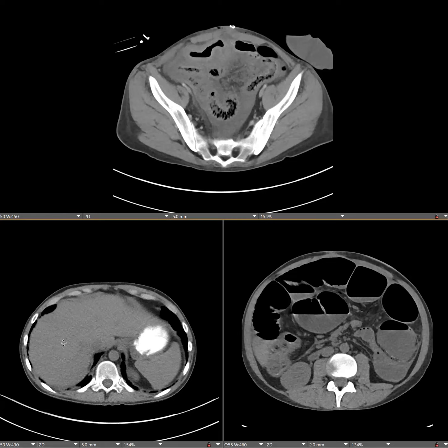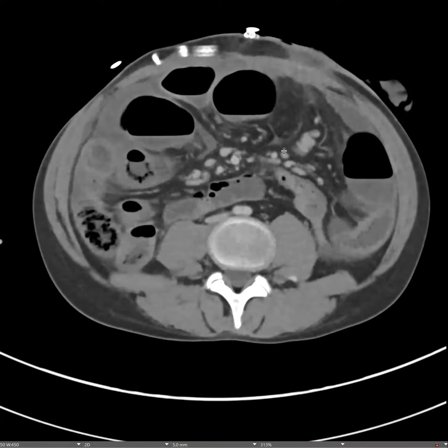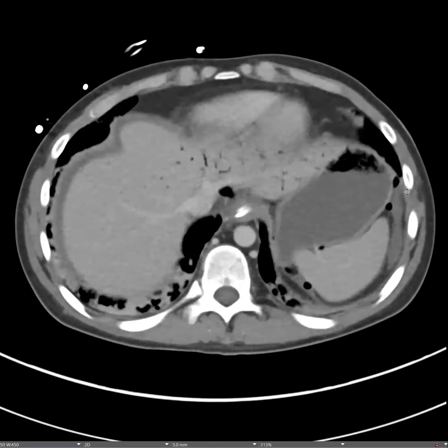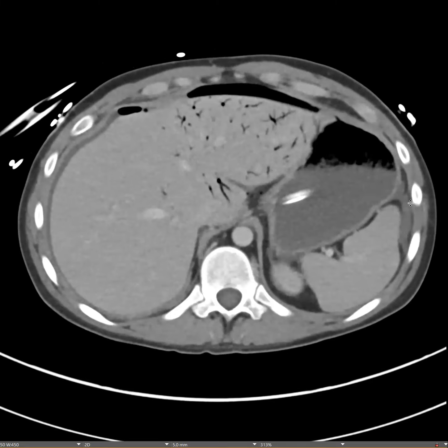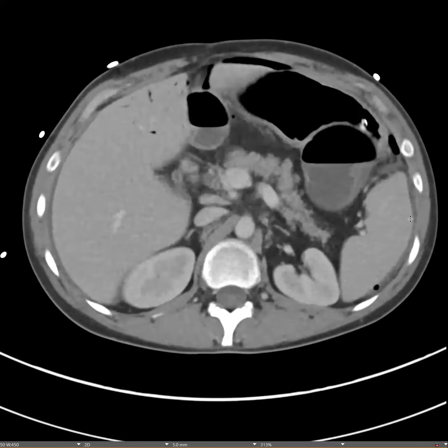One question, you said pneumobilia, you meant portal venous gas? Sorry, portal venous gas. Can you just show that? Because that was pretty extensive portal venous gas. And it's a nice example of how it tends to go branching and peripherally, whereas pneumobilia will be more central, because that's the direction of flow of the bile.